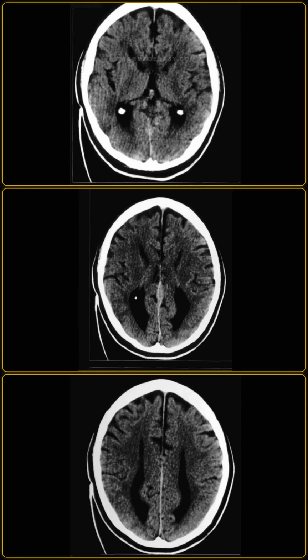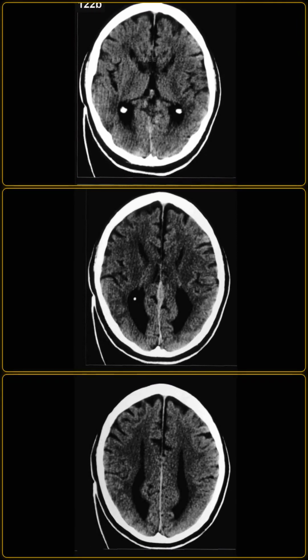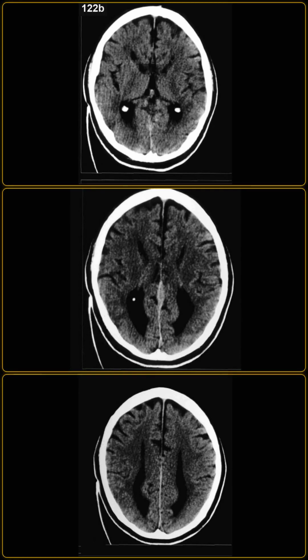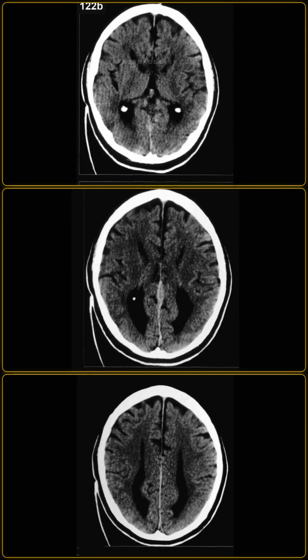The differential diagnosis includes corpus callosal dysgenesis, partial agenesis, and acquired corpus callosum destruction, secondary to perinatal ischemia. Ischemic destruction typically spares the rostrum or genu, but results in thinning and focal volume loss, whereas developmental dysgenesis follows a strict embryological order.